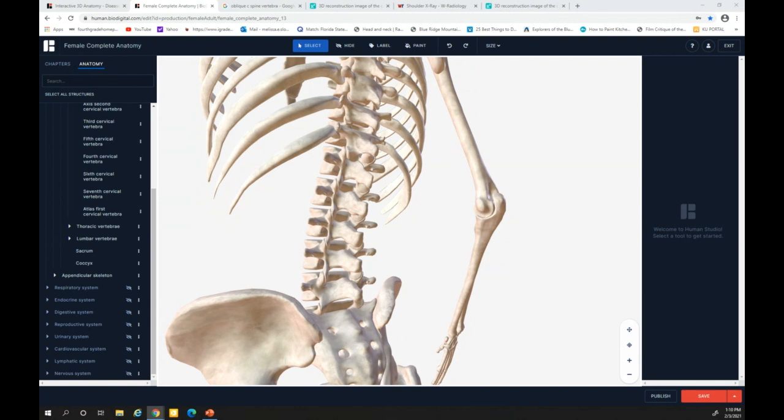So notice the white screen, we'll see the white screen as the bucky. Let's pretend that the patient's standing up at the bucky, because we can do L-spine standing up too. The white part is the bucky. The way that we see this here is that the patient's left side, see how the ribs are big here, and then the ilium is wide here.